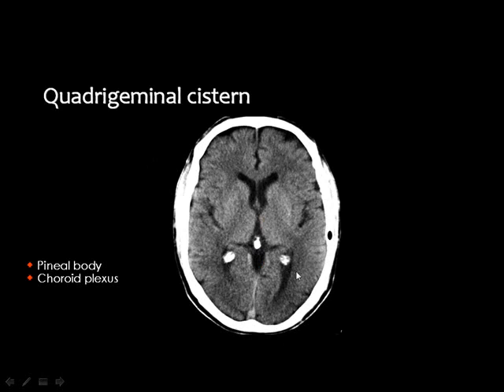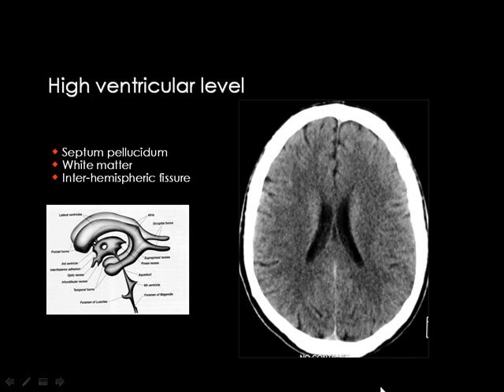And these calcifications are constant and considered normal findings in adults. Everyone who performs a CT scan of the brain in adult patients will have these 3 calcific foci. The one in the middle is the pineal body, and the left and the right calcifications in the occipital horn of the ventricle represent normal physiologic calcification in the choroid plexus inside the ventricle.